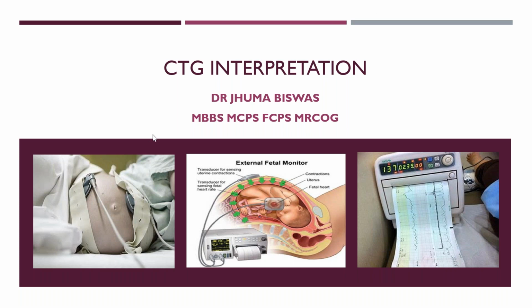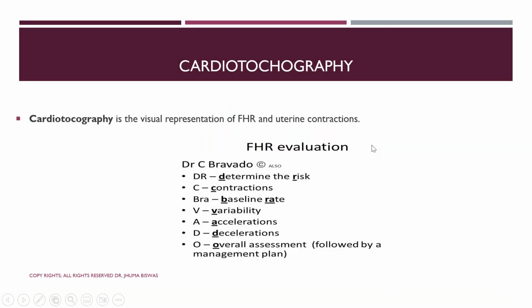You have to understand how we manage here in a labor ward, what the interpretation of CTG is, how we usually interpret it, and according to the interpretation how we are going to manage. So let's start with the CTG.